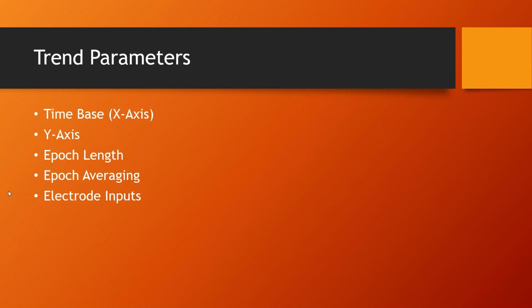So that's a good question. Really, you're only going to identify artifacts if you're unsure of what you're seeing in the trend panels. Trend panels are one tool. Just like the trends themselves are simply a tool, there's no tool that will work for everything. So in the trend panels, you can identify things that go on based on their different characteristics, but to really identify exactly what it is, you go back to the raw EEG.